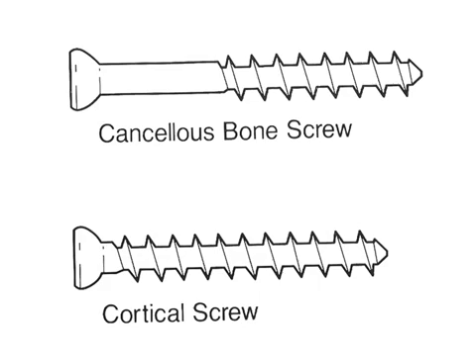These are 2 types of screws, the cancellous and the cortical screw. The difference between the two: the cortical screw has a bigger central diameter, the root diameter, but the pitch, that is the distance between consecutive threads, and the depth of the threads is less, and they are usually non-fluted. But in a cancellous screw, although the root diameter is less, they have more pitch and more depth. So they are used for cancellous areas, right? And also one more hint: although cancellous screws can be fully threaded, usually when they show you a cancellous screw, they might show you partially threaded, but it can be fully threaded also.